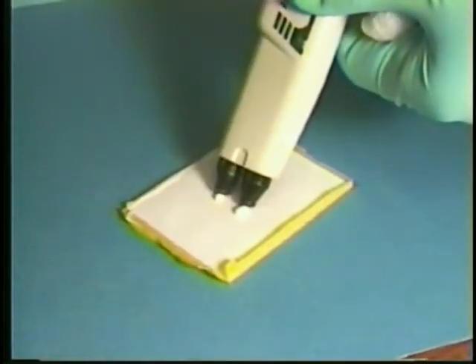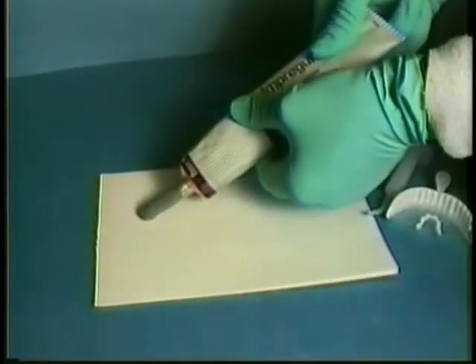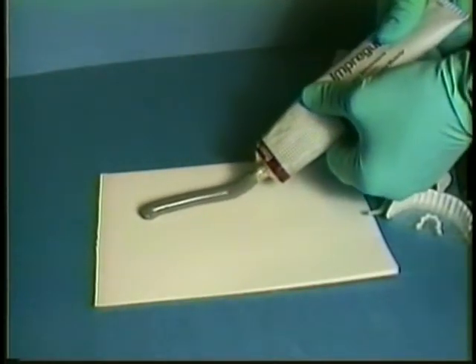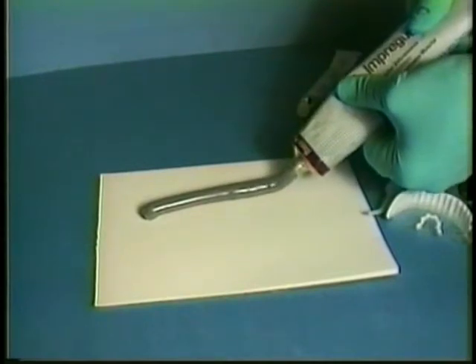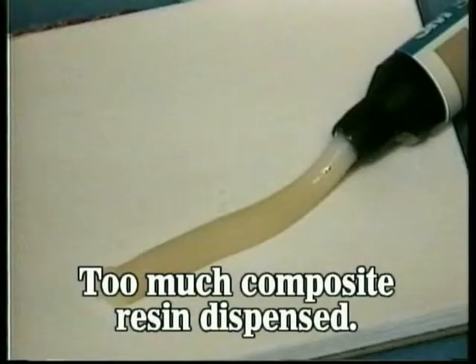We'd like to take a moment to discuss the importance of conserving dental materials. Dental materials can be extremely expensive. Every dental assistant should make every effort to learn how much material is needed for the typical procedure in order to avoid wasting material, which would cause unnecessary expense for the dental office.